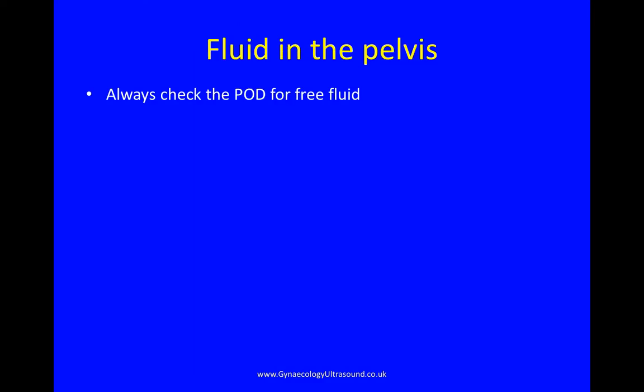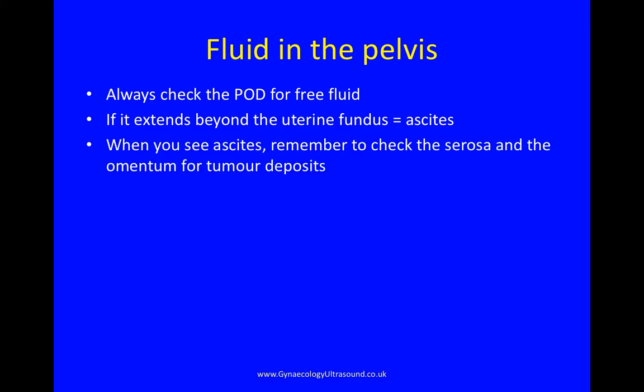More generally, thinking about fluid in the pelvis, always check the pouch of Douglas for the presence of free fluid. If the fluid extends beyond the uterine fundus, it's now known as ascites. When you see ascites, remember to check the serosa and the omentum for tumour deposits.